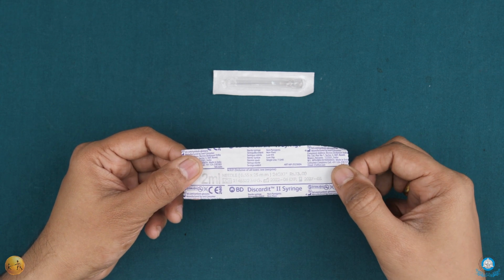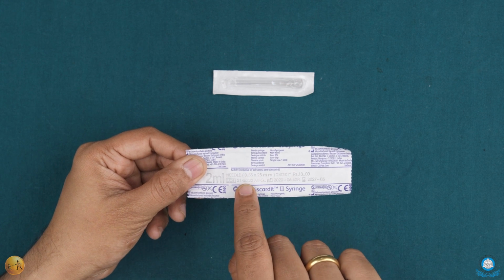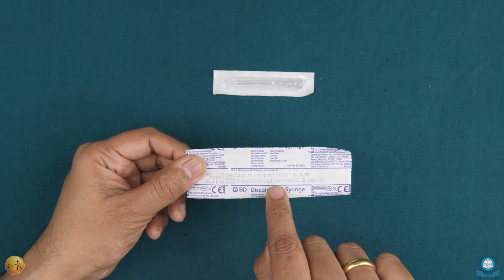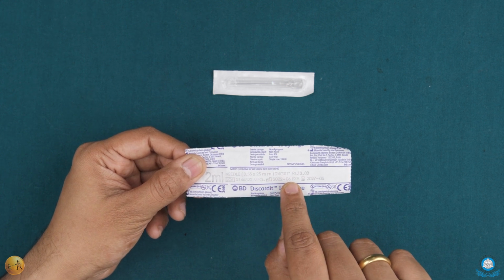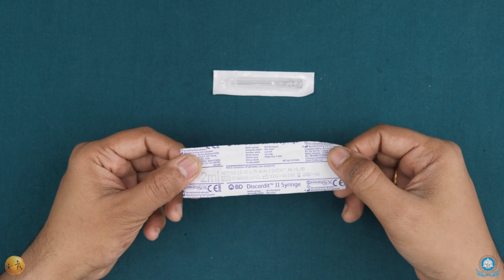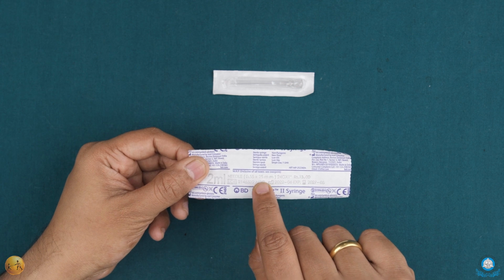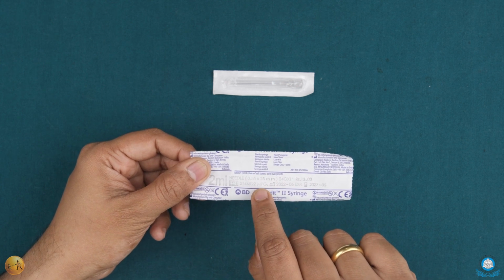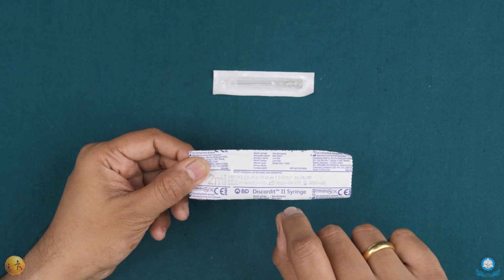Having said that, we also need to understand the needle dimensions. Now if you notice in the bracket, you have 0.55 times 25 millimeters, and then beyond that you find a number written as 24G times 1 inch. Okay, so what this basically means is these are the dimensions of the needle in the metric as well as the imperial system. Now the metric system of measurements is basically in millimeters, whereas the imperial system of measurements is in inches.